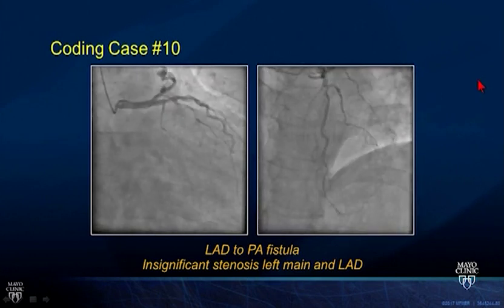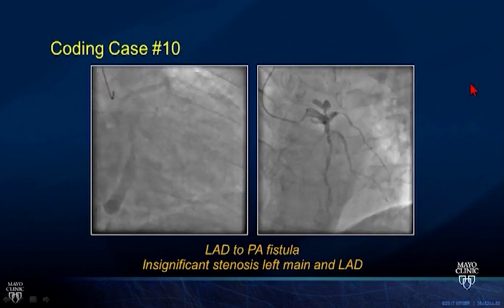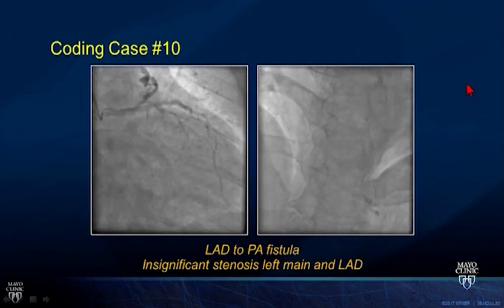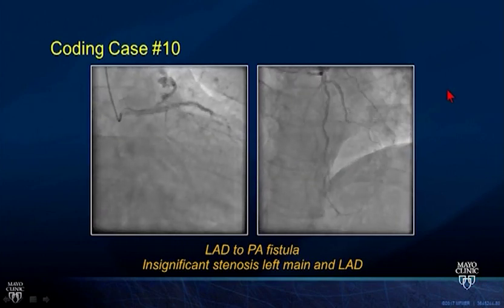You can also code that there's insignificant disease in the left main and LAD here. So this is one that you should be aware of. This is one of the more common fistulas that we will encounter in clinical practice.